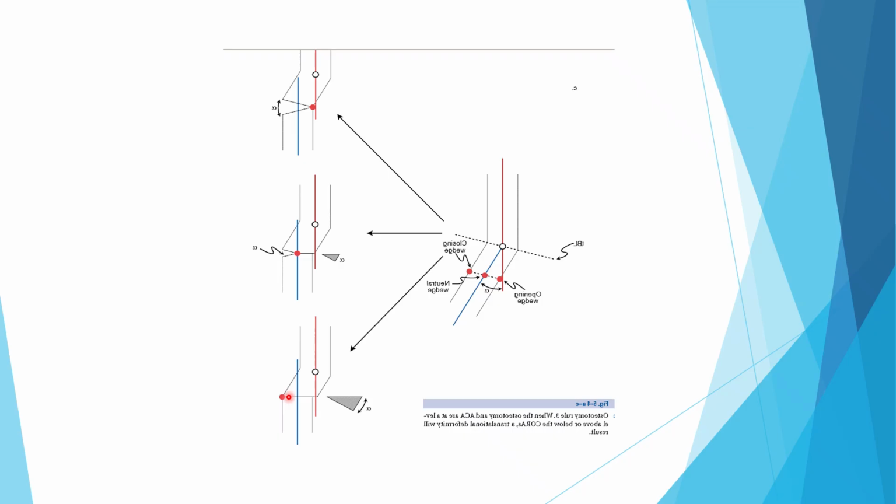Can this be allowed? No, because the only way to do this is actually to remove a piece of bone. Remember, you're putting an X fix, so you're not doing an acute osteotomy. You did not take a piece, because if you see here, you did the deformity correction on this point. So the only way to do this is to move this piece of bone this way, basically removing this piece of bone here. And that cannot be done in the X-fix.